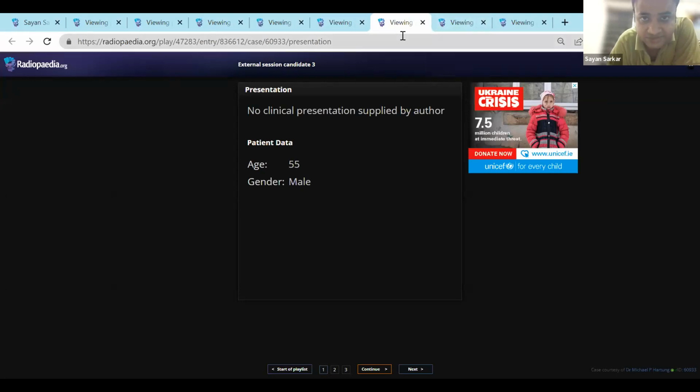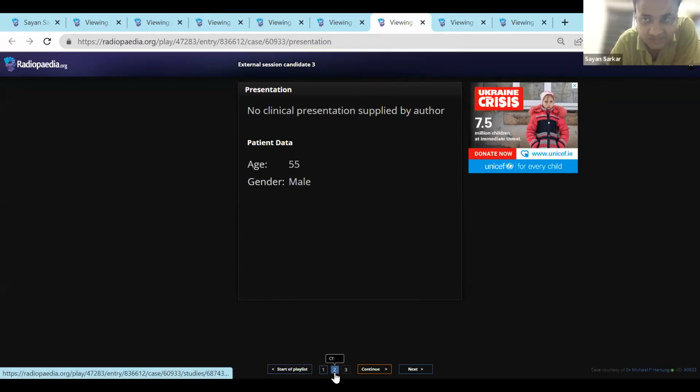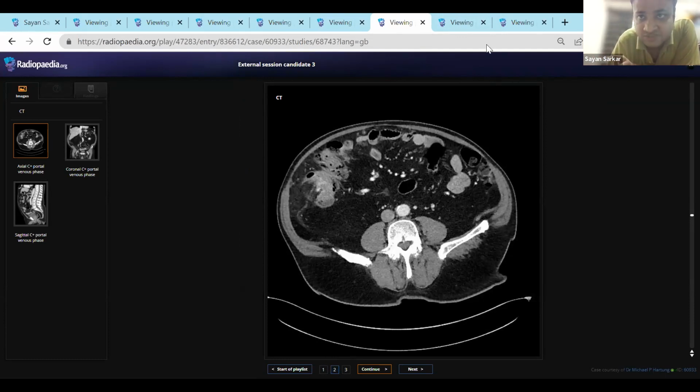So you're candidate 3, right? Yeah. Okay, so Dr. Ruby, this is your first case. I've forgotten what case it is. Just let me see. Right. So this patient came with abdominal pain and discomfort. Can you request control? I will give you. Wait. You can scroll.